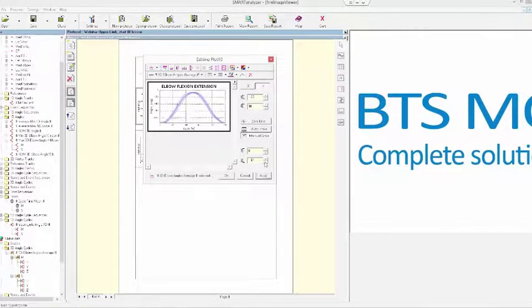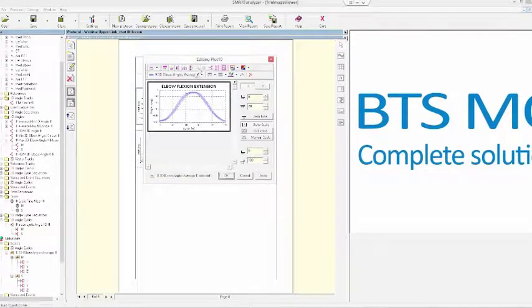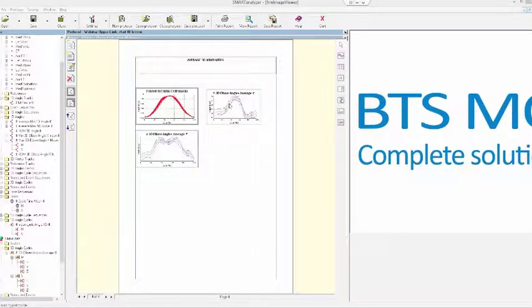Okay, I can type the name, otherwise I can also use this arrow. And sorry, I also want to show you how to change the color, for example, of a graph. So you can see from here we can change the color, we can also change the line width, and so on. Okay, if I want, I can do the same also for the other.